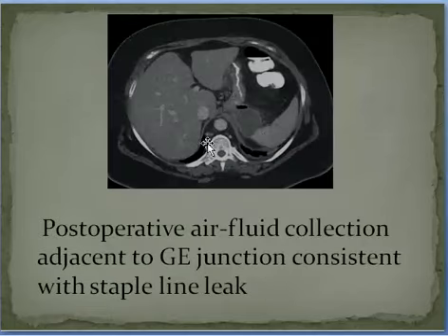This is the usual site of abscess formation, adjacent to the staple line of the stomach and near the spleen. This is the usual site.